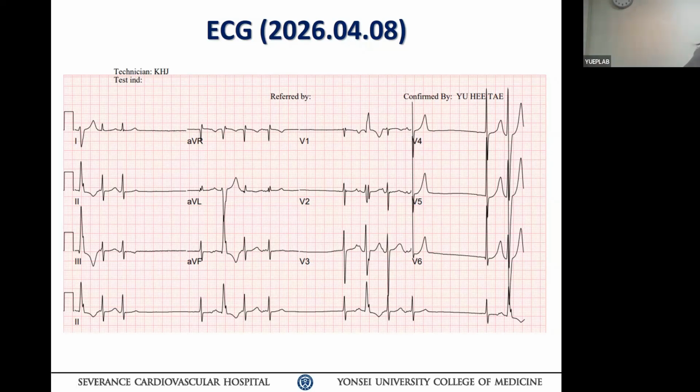Another thing, I would like to ask whether this one is noise or a P wave. I'm not sure, probably noise. There are no P waves before this rhythm. I need to know if it is a real P wave. Some patients show this kind of rhythm after major surgery.